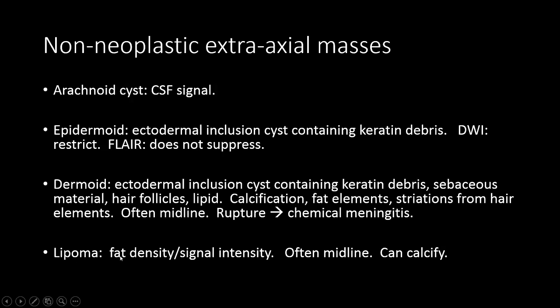Lipomas are fat density and fat signal intensity. They're often midline, associated with the corpus callosum. They can occasionally calcify, and as such, lipomas and dermoids can occasionally be difficult to differentiate from one another.